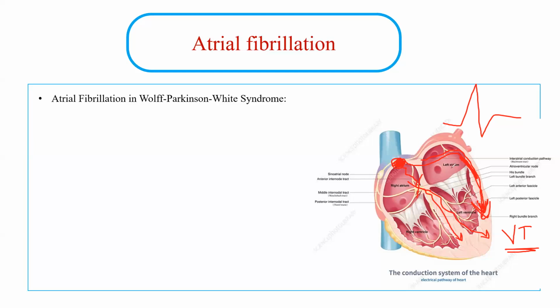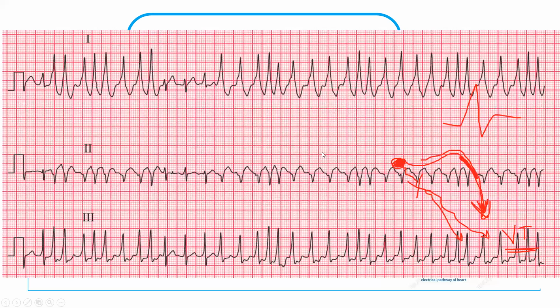Okay? All right. Let's have a look at an EKG here. Okay, this is important. All right. So if we look here, we can see that the patient has a very irregular heart rate, right? Very irregular. Number two, the QRS complexes are wide. So the patient has irregular wide complex tachycardia, and there are no P waves before the QRS complexes.